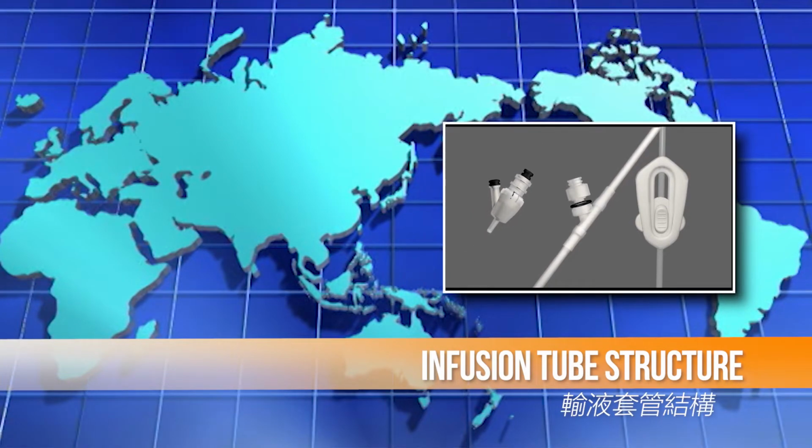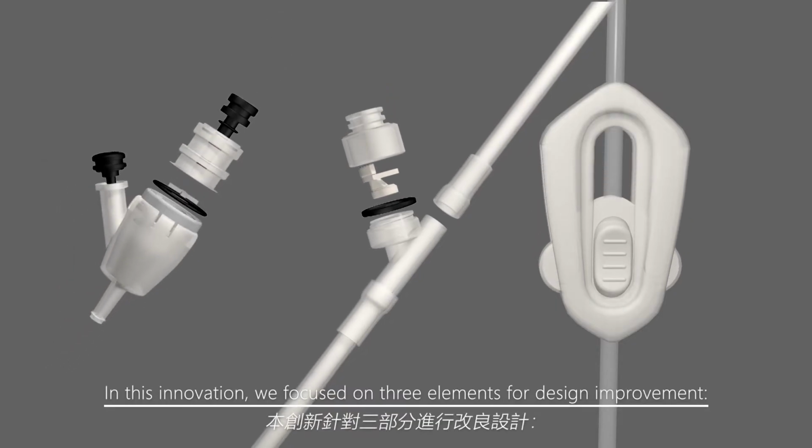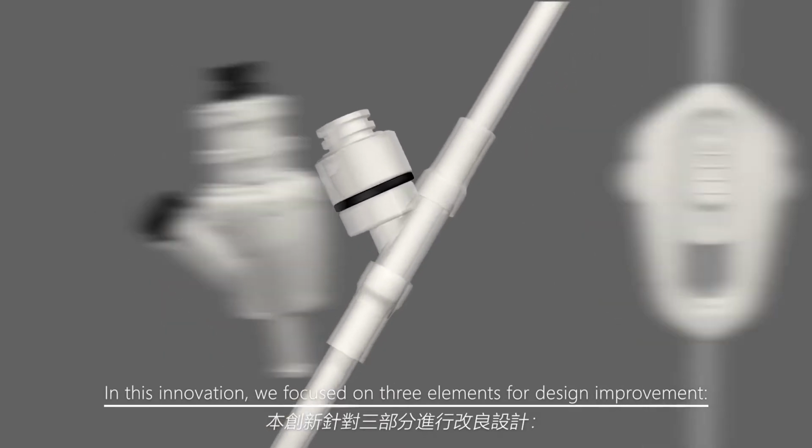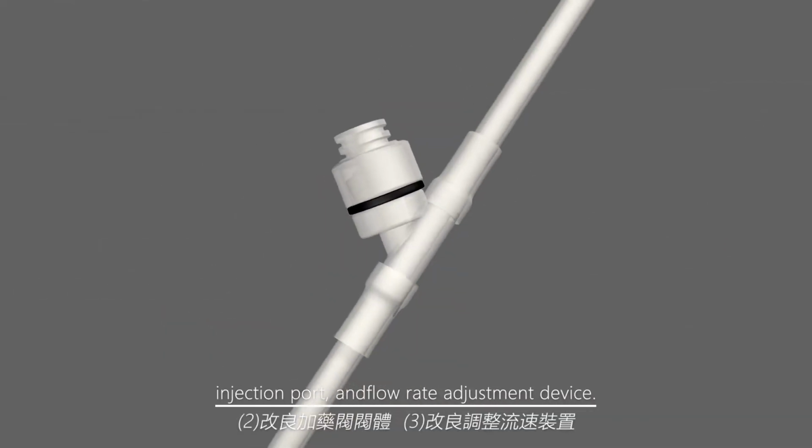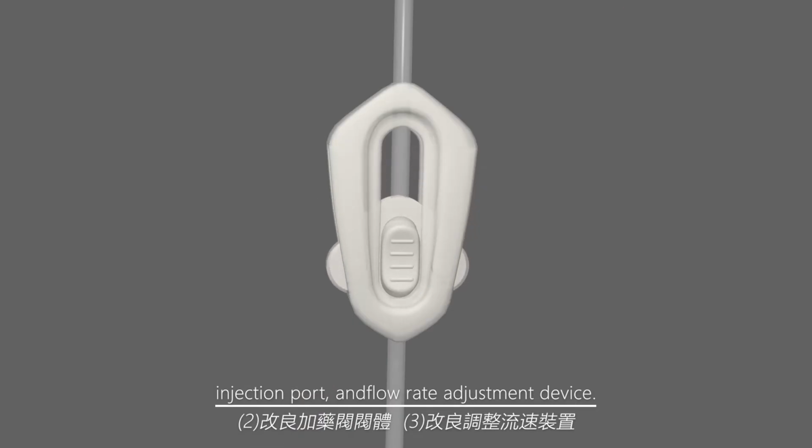Infusion tube structure. In this innovation, we focused on 3 elements for design improvement: a Y-shaped backflow prevention structure, injection port, and flow rate adjustment device.